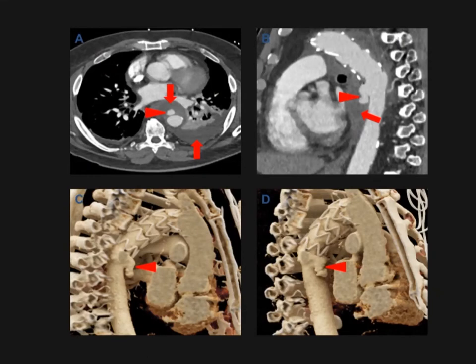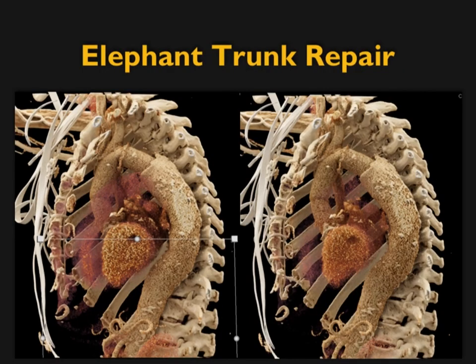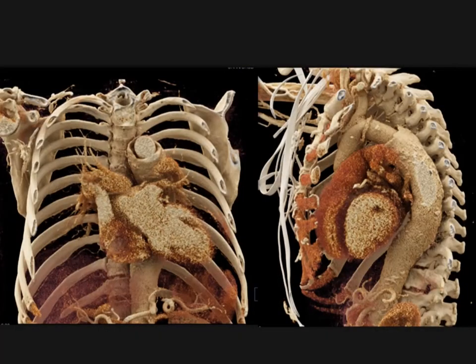Also in things like mycotic aneurysms, presence of aneurysm, extent of aneurysms, important for planning. So in this case, aneurysm anteriorly projected off the patient's descending thoracic aorta, just beneath the endovascular stents, shown nicely in the sagittal views. And then the relationship to the stent and the extent very nicely shown on the 3D imaging. Or in this patient with an elephant trunk repair, you can very nicely see the elephant trunk. You can see the repair, and you can follow this patient very nicely, and we do.